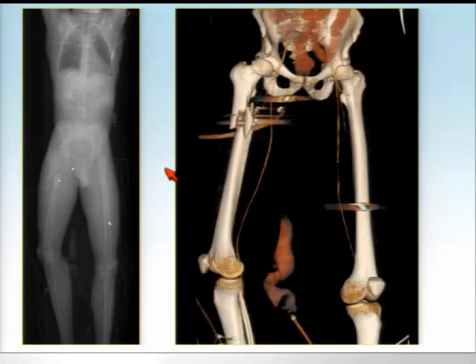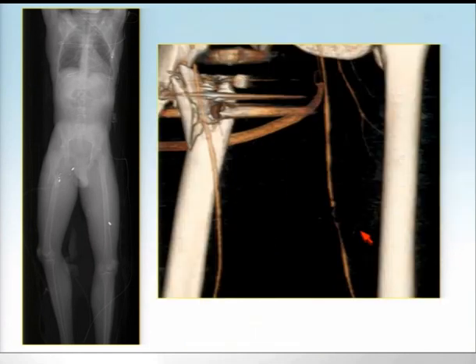This patient suffered multiple gunshot wounds and required pelvic CT angiography in addition to extremity CT angiography, so you can see that the coverage was extended to include the pelvis. Also note the presence of positive oral contrast agent, positive rectal contrast agent in this triple contrast examination, and this patient also suffered an injury to the SFA on the left side. You can see a focal area of narrowing of that vessel.